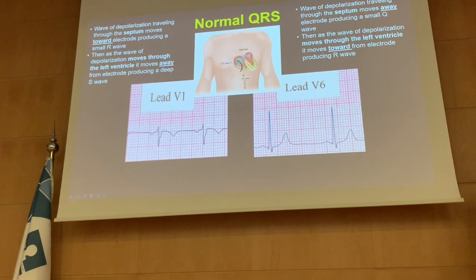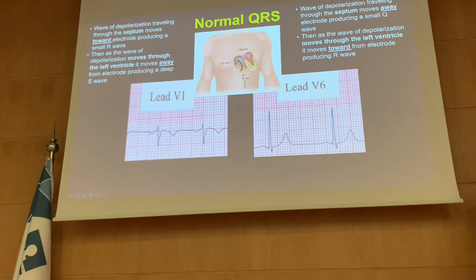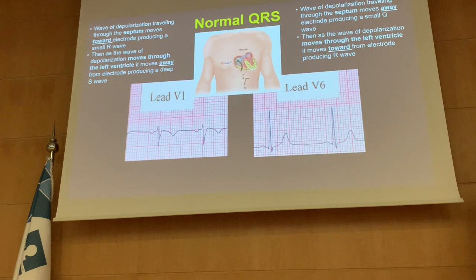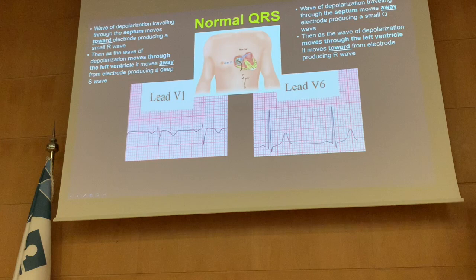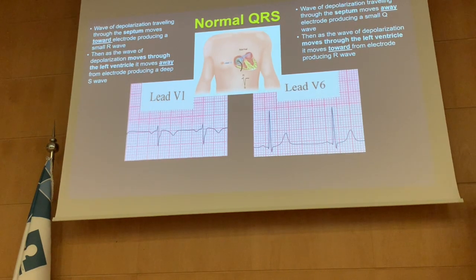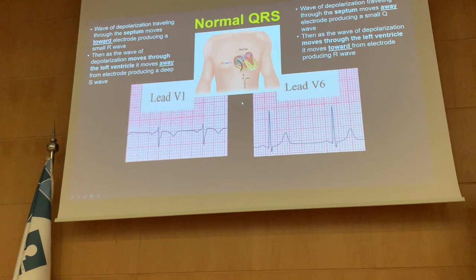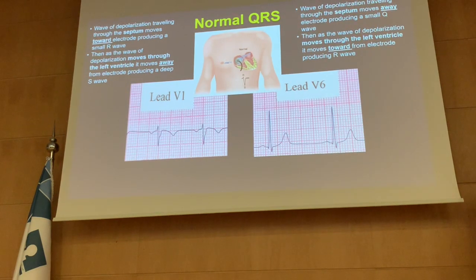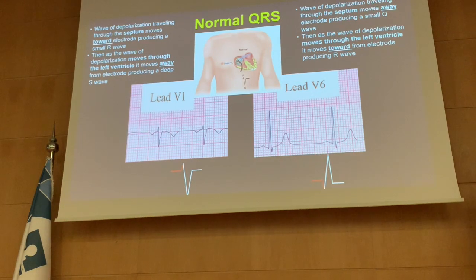Remember this. There are a lot of criteria to diagnose left ventricular hypertrophy. Faisal, because you are so good, we give you all the criteria and then we'll ask you about them. The easiest one is what we call the Sokolow criteria. And it's very easy. Just relax and follow with me. So if you have a patient with left ventricular hypertrophy, how can we create a scenario?